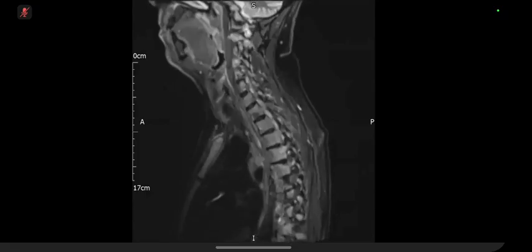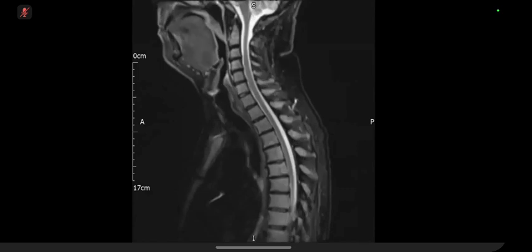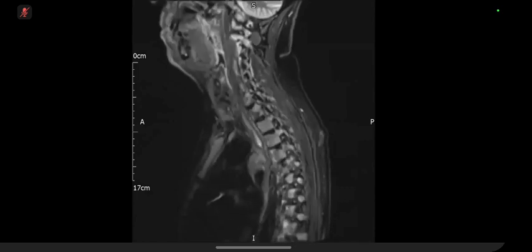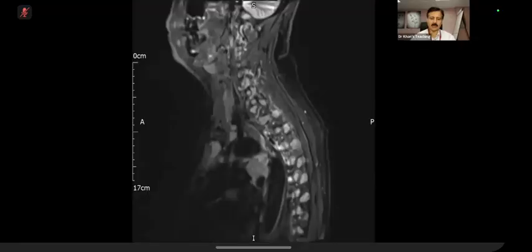Yes, I'm just going to have a look if there's anything in the lungs. So there is a... Yeah, this one. I think there's a mass here. Excellent. Okay, I will take over. Well done.